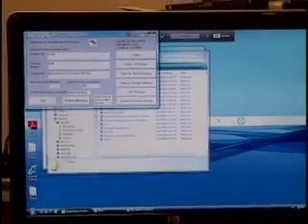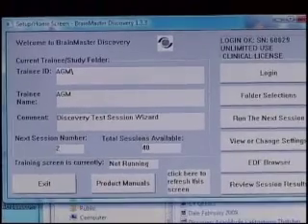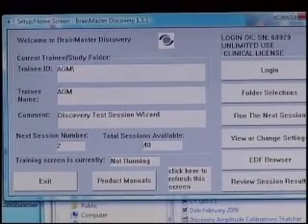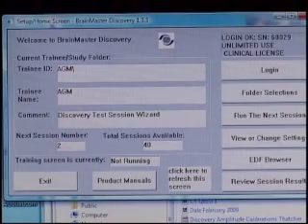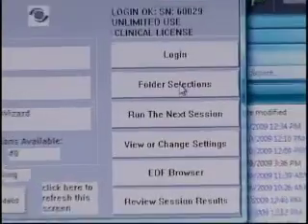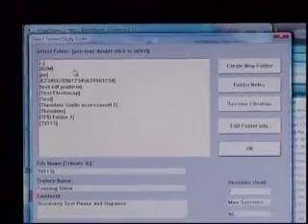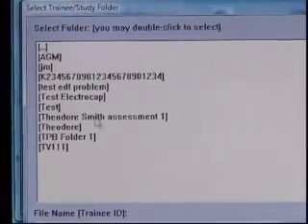Okay, we've completed the study, and we've made a report and created various files. And now I'm going to show how to copy the files over to a server location, another computer at your facility, and to clear the files off of the local computer. When we go to folder selections, we see that this particular computer does not have a lot of folders.